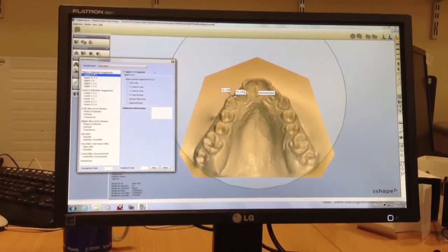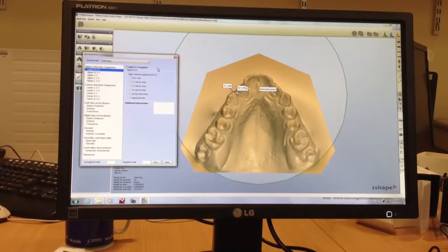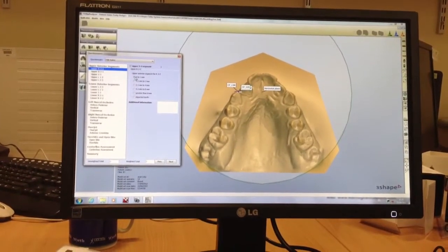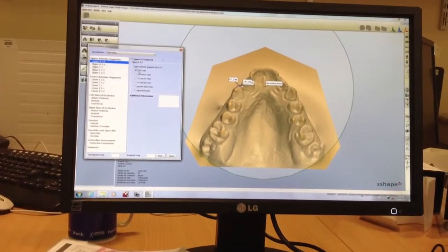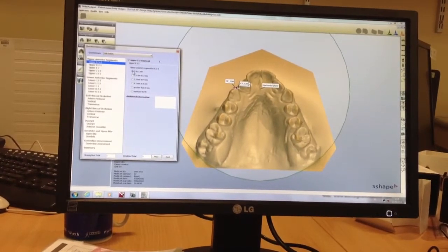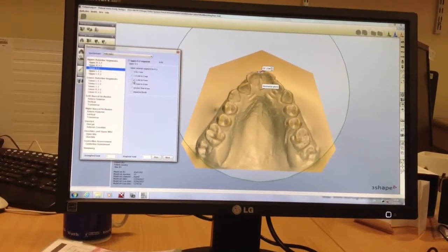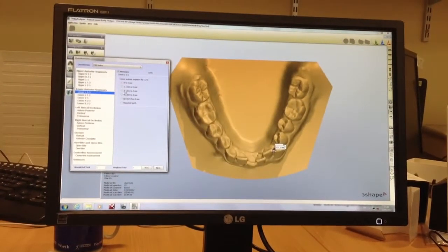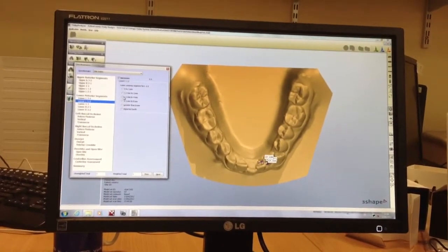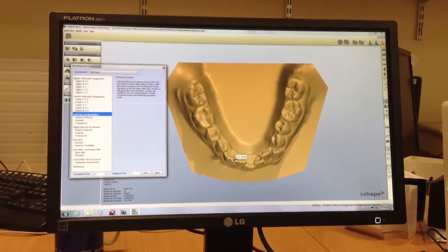So the upper right, 3 to 2 contact points. The software shows us the points here. It gives us the value, which is exactly 1 millimeter, and then we can check off the value. There we go. If it's an impacted tooth, we can select it here. Perfect. And then we can click on N for next. It jumps through to the next pair of teeth, 3.09, 0.066, 2.21, 1.47, 0.95, 2.5, 1.63, 1.79, 0.49, giving us a score of 0.